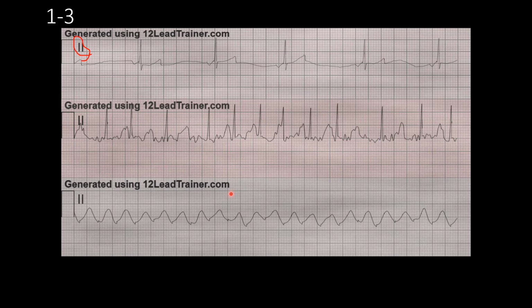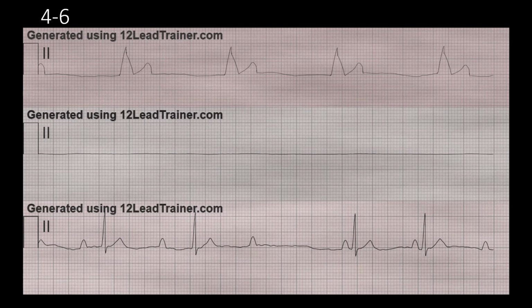If they're unconscious, feel for a pulse, because you have to do that anyway to confirm. If you do feel a pulse, then that's again VTAC, because VFib will not have a pulse. Other than that, if there's no pulse with this, I would just consider it to be VFib, and it would be coarse VFib. Alright, pause the video.